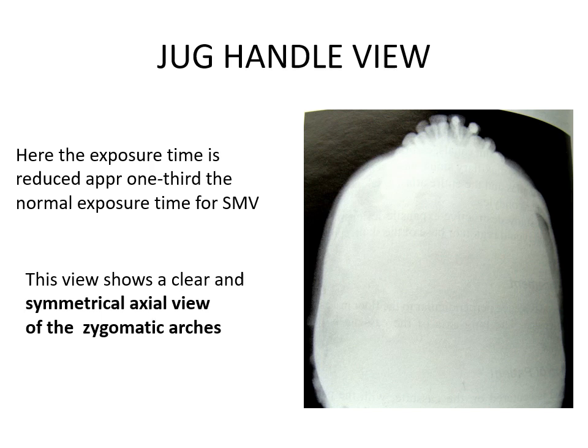It also helps to study the expansile and destructive lesions of the palate and the sphenoid sinus. Next one is the jug handle view. It's a variant of the sub-mentovertex view.